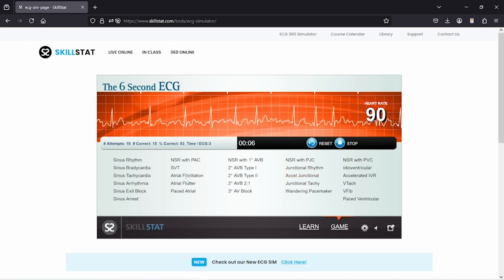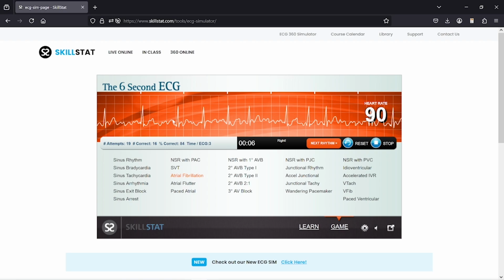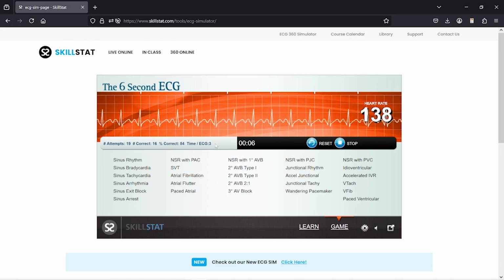This is atrial fibrillation. We can see here because it's just nonsense. We have these weird abnormal P waves. We have our QRS complex, which is nice and tight. However, the QRS complexes do not match up with each other. The P waves are indistinguishable. Some may argue, oh, well, isn't that a P wave? Sure, I guess, but look at all of this nonsense here. So we really can't tell if that's actually a P wave or if it's more so inverted with the T wave. So very difficult to distinguish. That's why it's an irregularly irregular rhythm.